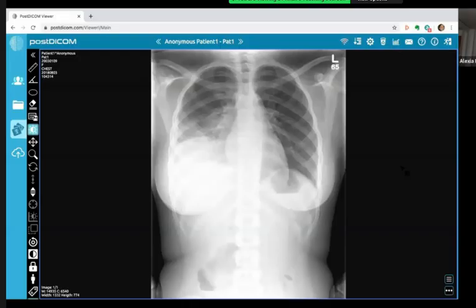Okay, so this is right lower consolidation, mostly pneumonia, given the history. I'd like to correlate, of course, with the inflammatory markers and the clinical picture, as you said. A lateral X-ray would help localize the pathology. An ultrasound also would assess for associated pleural effusion.